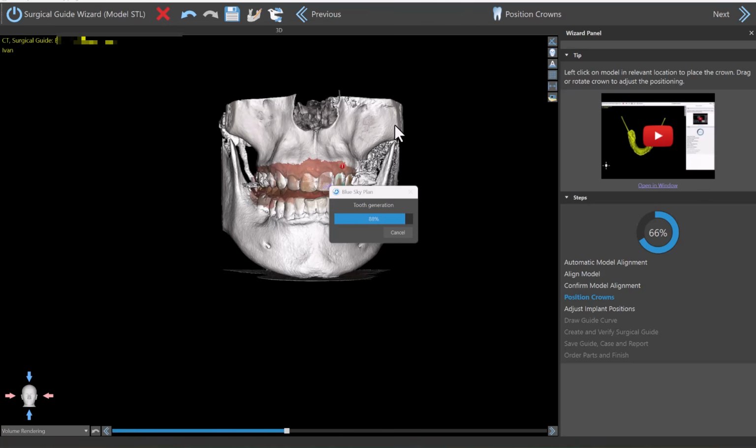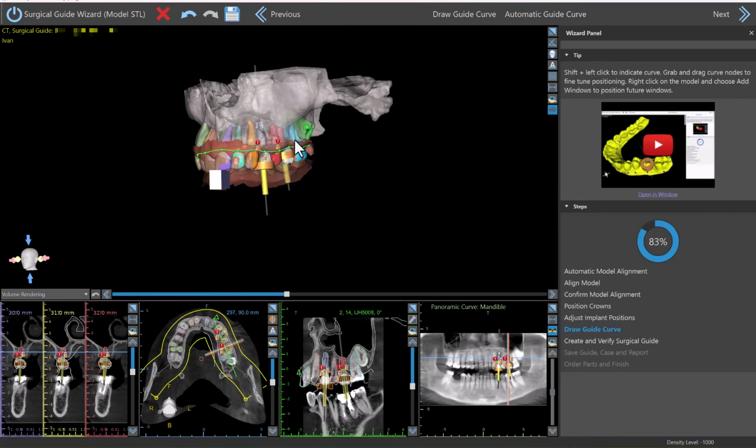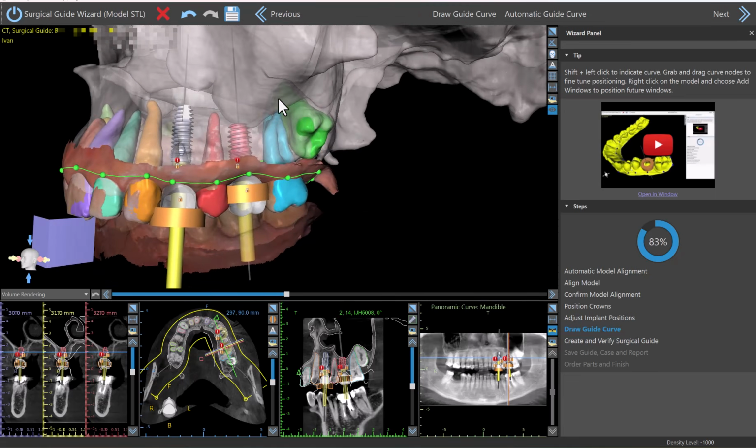Now this process could take a minute or 2 or 3 depending on your computer speed. I run it on a laptop and generally it takes me around 2 to 3 minutes. It's doing a lot of automated steps here. So we could let it run until we get to this screen. We see the process has finished, and let's take a look at everything that we're seeing on the screen.